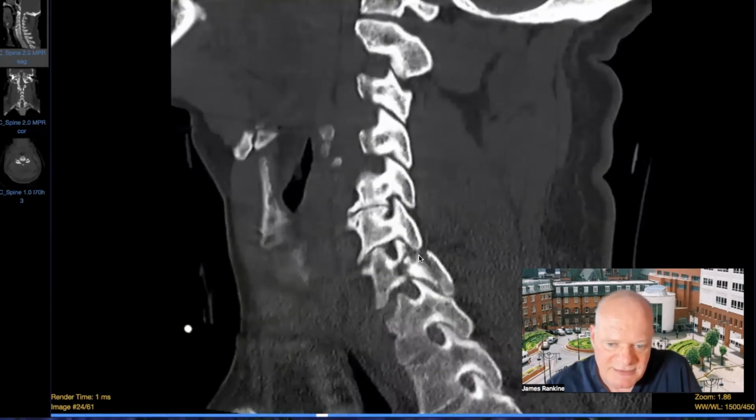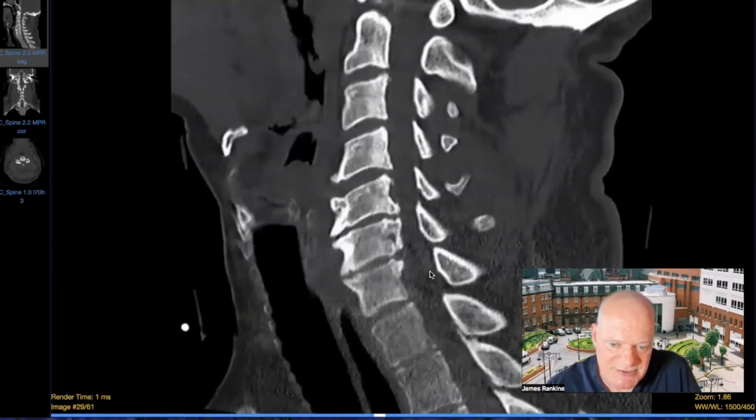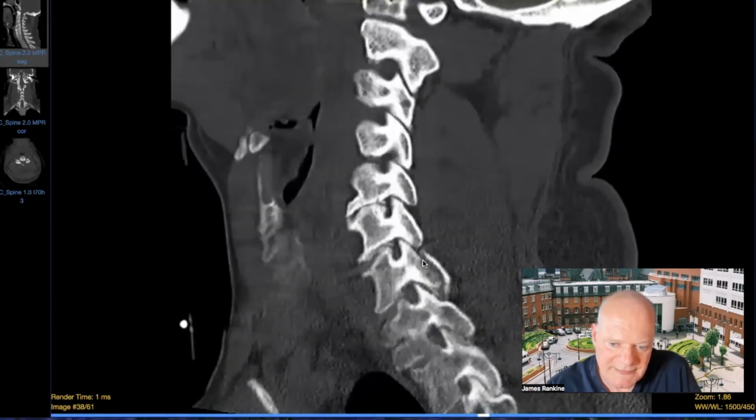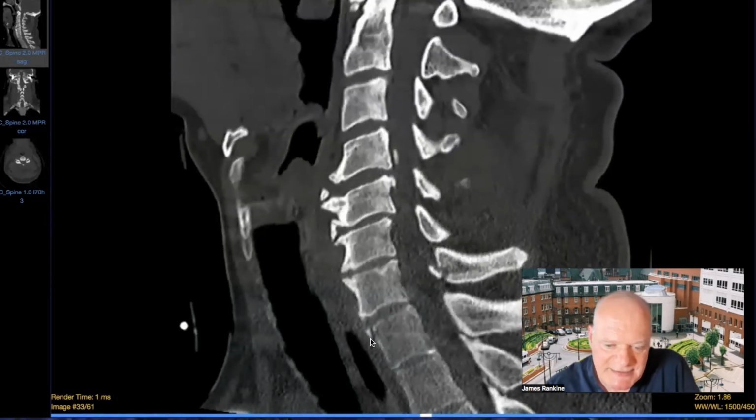And I think you can already see that there's a longitudinal line. There's one line running down here. There's one running across the pars interarticularis here, running straight down. And again, there's a longitudinal fracture here. Now I notice there's a little flake of bone here. I'm going to describe the orientation of fracture lines with fragments of bone at the front of the spine.